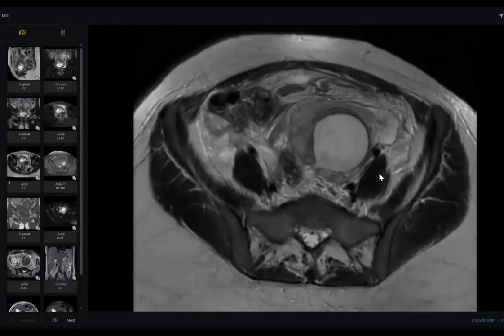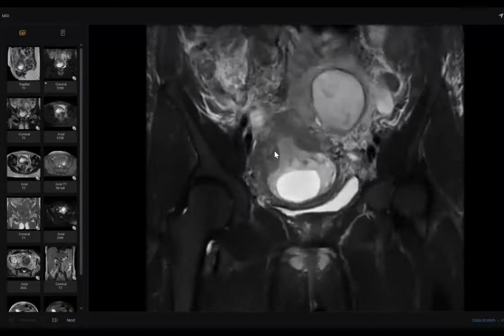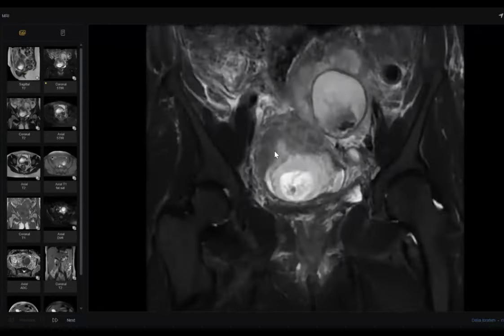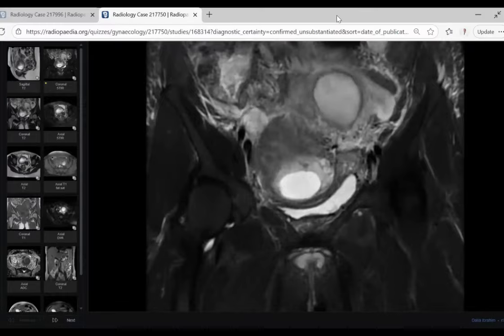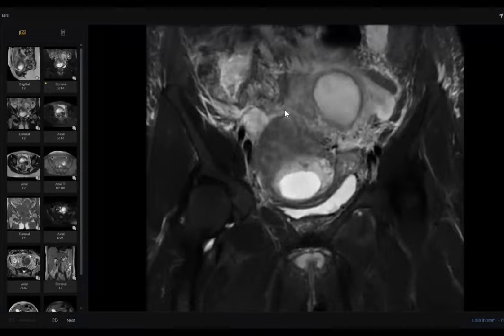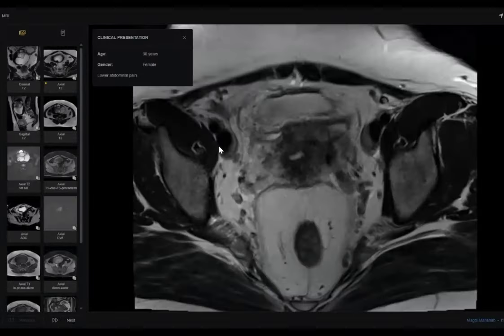Second point, in torsion, if you bring the STIR, you will see very severe edema, very characteristic edema, very, very characteristic to torsion. Okay. And some signs will help you because here this is a limited study due to absence of post-contrast images. Thank you so much. Next candidate.